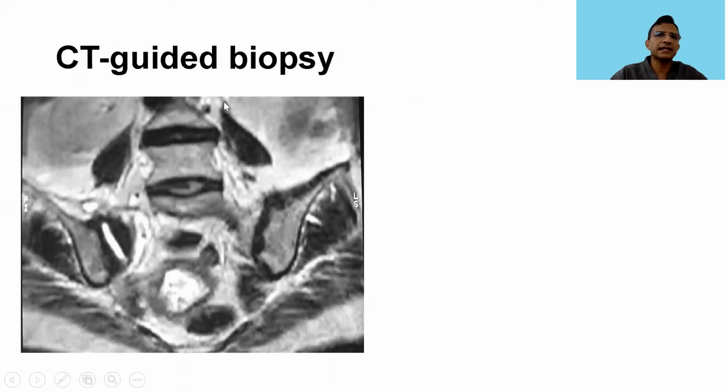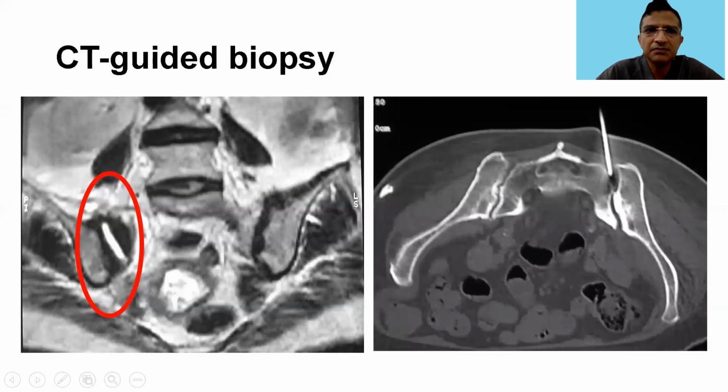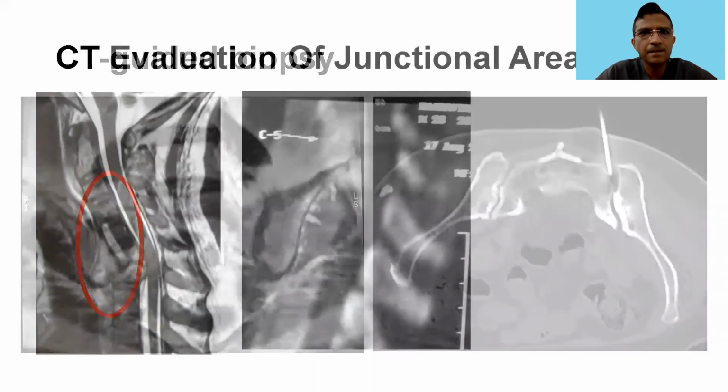It can also obviously help us. A CT-guided biopsy can also be a useful modality in investigating a setting of spinal infection. So this is an illustrative case with hyperintensity seen in the SI joint, taken up for CT-guided biopsy, and accordingly appropriate treatment was carried out.